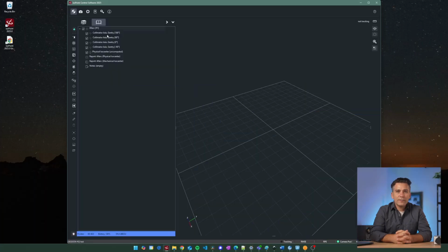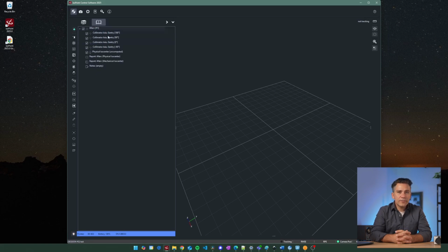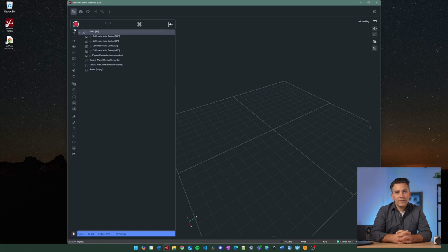Quick tip, there are 2 ways to start measuring: by clicking the acquisition button with a single measurement selected in the tree, or with a dataset selected in the tree. Starting with a dataset selected, we'll start a workflow for measuring the entire dataset. Starting with a single measurement, we'll start a more limited workflow intended for just that one measurement. Select the dataset in the tree and click the acquisition button to open the measurement control panel, initiating the workflow to measure all the collimator axes in the dataset.